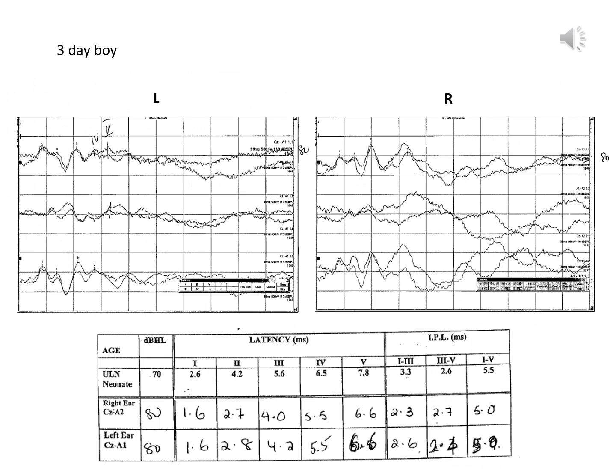This is a brainstem auditory evoked potential in a 3-day-old baby boy. And so at 3 days old, the waveforms are very immature, and sometimes it's difficult to identify the waveforms of interest. And so the first thing to note is that the technologist has done this recording at 80 decibels. There's a little 80 written beside it. Most likely at 70 decibels, the waveforms were just not observable. But these are pretty reasonable looking waveforms for 80 decibels in a baby.